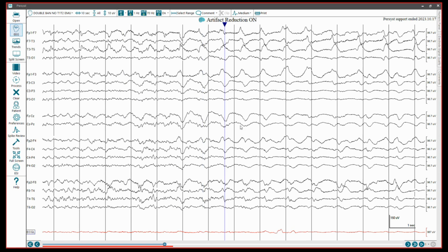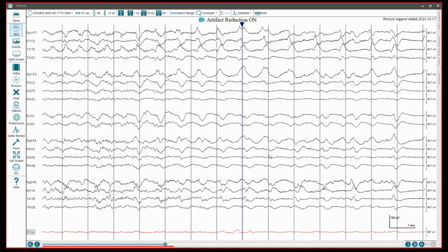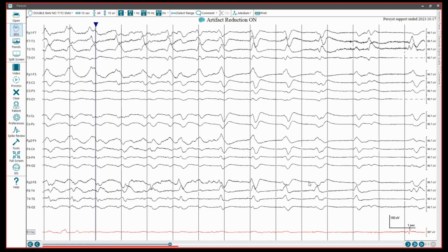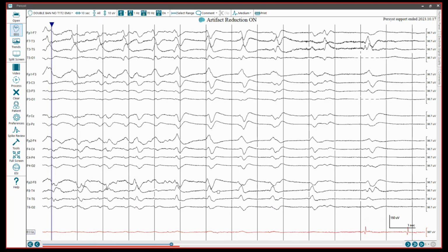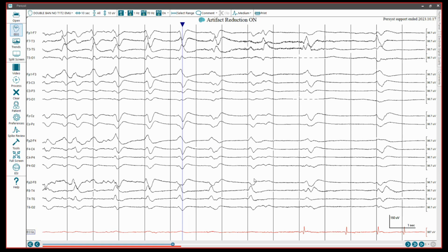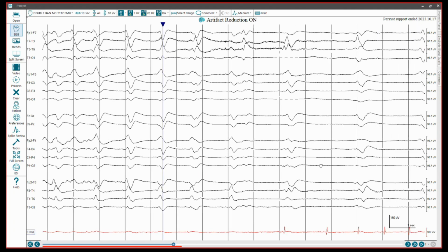Now, the ictal pattern transitions to GPDs, it transitions to periodic discharges at, say, 1.5 hertz, perhaps. And then that periodicity slows down, maybe to 0.3 hertz. And then we see there's this post-ictal suppression. So the brain, the cortex, is just exhausted. So it's going to take a few minutes, it's going to take a moment to reset.